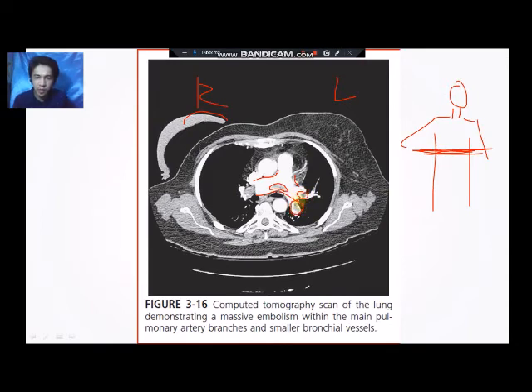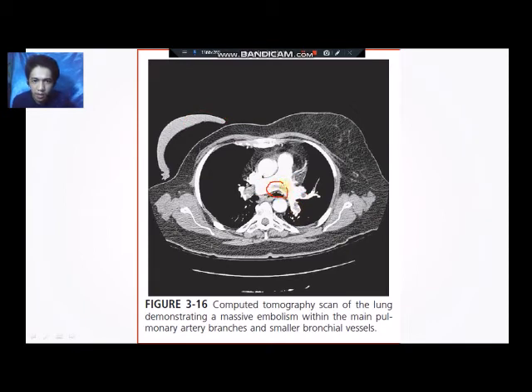Okay, and also in this part, let's highlight this one, and then this one. Okay, right? The artery is very white, very dense. But then parts of the artery have a somewhat grayish appearance. Okay, so that is an indication that there's a material there that is blocking the blood flow going from the right ventricle towards the pulmonary artery of the patient. So if there is a blockage in the artery, then of course the blood flow towards the lung tissues, towards the alveoli of the lungs, will also be blocked off.